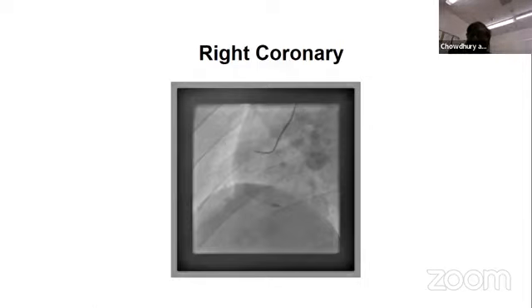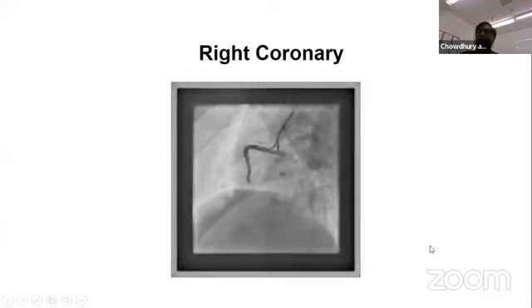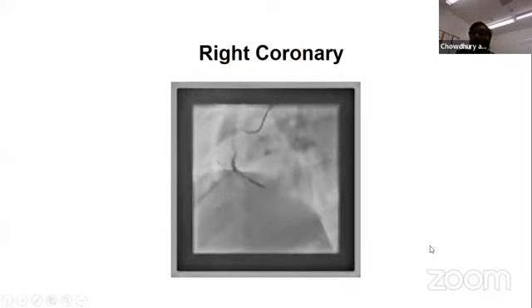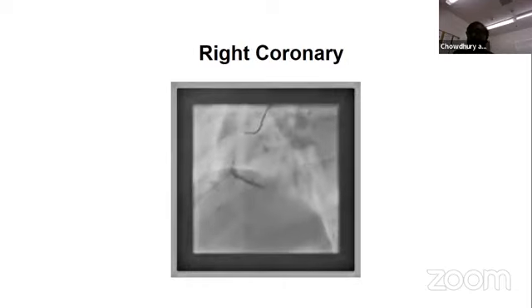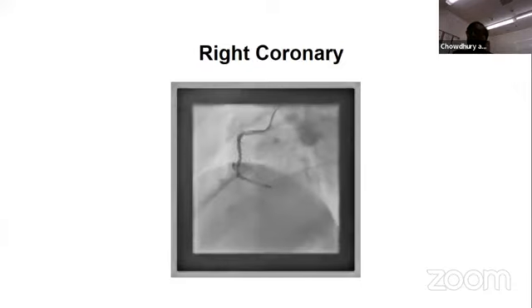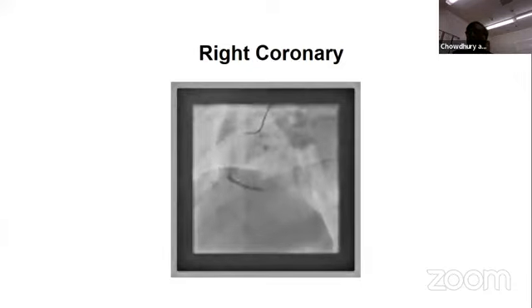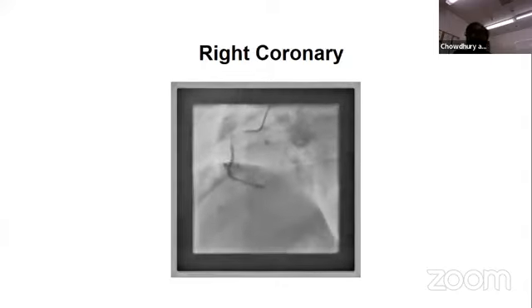One thing is the academic exercise of getting the EKG right in the exam. But the important thing is the practicality of managing patients. As Wadud mentioned, repeat EKGs, dynamic changes, the clinical situation getting worse, and assessing heart rate and blood pressure are important. But how important is it to identify the culprit artery from the EKG, and why is it important to remember?